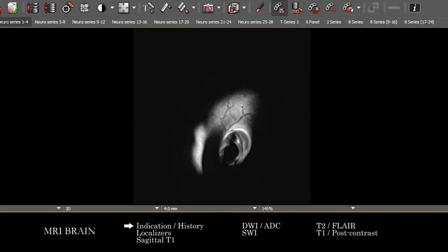The way I'm going to take you through this search pattern is as if there is either no known abnormality, or we are looking for something new. Frequently, in an approach to a patient who already has a known abnormality, you can take a quick look at that first, evaluate its positives and negatives, and then come back and just make sure you're not missing anything else. But we're going to do this as if we are searching out in all of the anatomy a potential explanatory pathology.